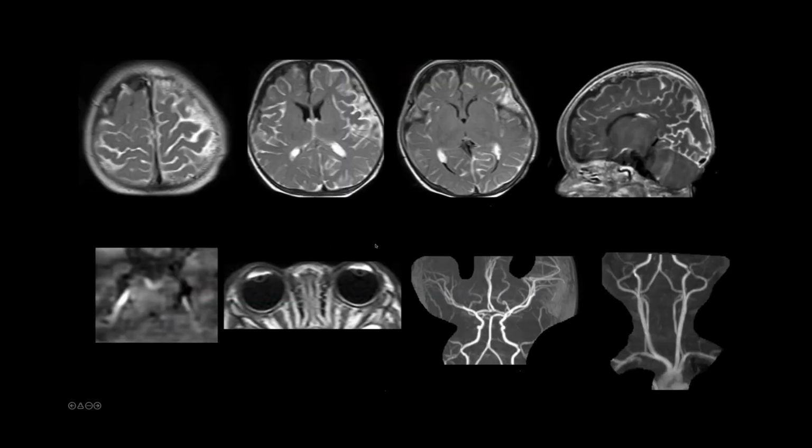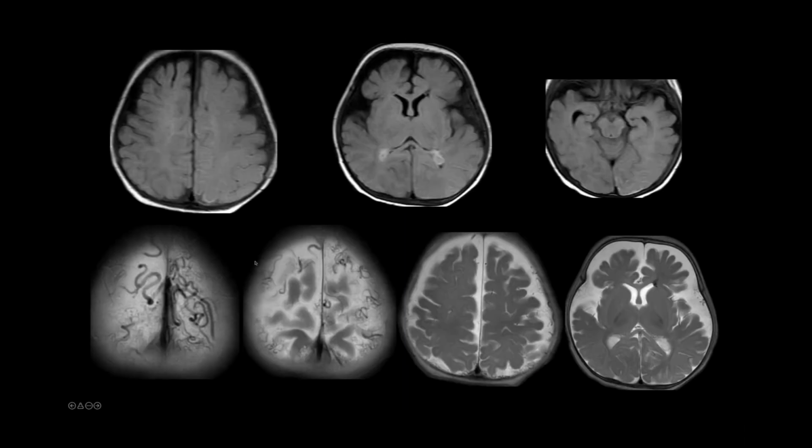The only question was, I was not able to find any. I mean, are these cortical tortuosities common or not in Sturge-Weber syndrome? The rest of the imaging findings are possibly typically present, but the question was of the tortuosity of the vessels. Extremely common, Nihaal, and grossly underreported.